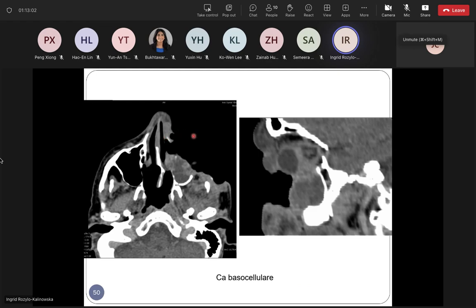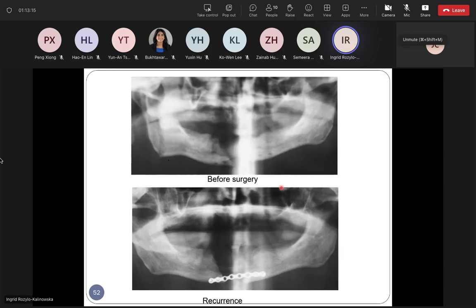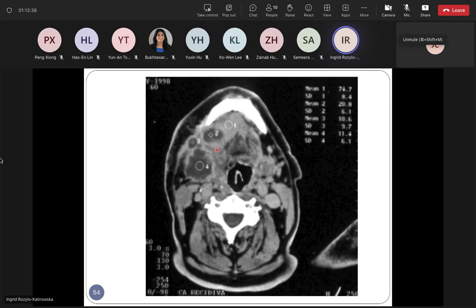So there is no cheek, there is no zygomatic bone, there is no zygomatic arch, there's just one huge ulcer under the eyeball. And radiographs and other diagnostic imaging methods may also serve as the means of verification of the lesions relapsing after surgery and treatments. Like in this case, there's relapse, and there are also metastatic lymph nodes with necrosis.